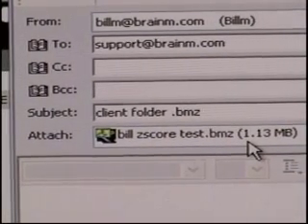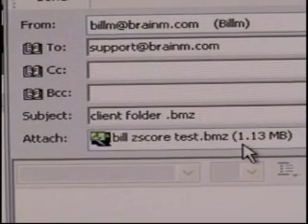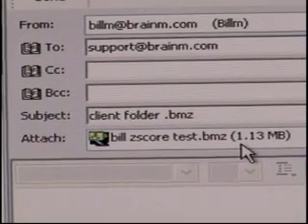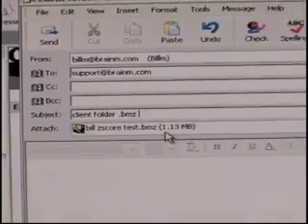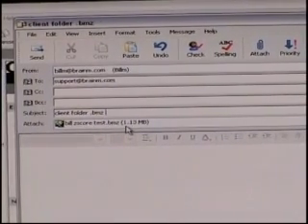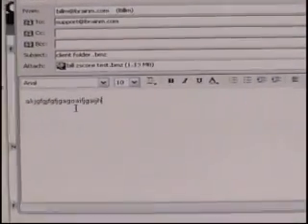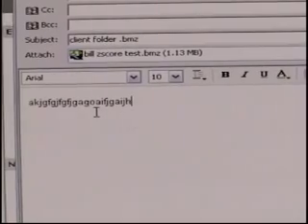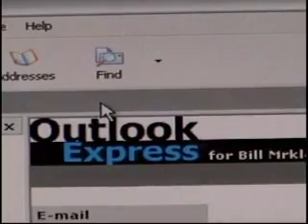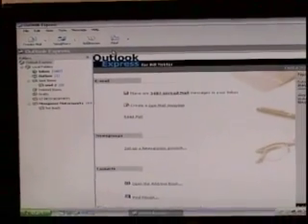but this time I've put it in there manually. So whether, again, I had that web-based email or an email server that wasn't compliant and didn't open on its own or wasn't automated, we can then use this manual version to go ahead and still get the file to the client. So again, in the body I could put any little message, just putting in filler there, and then I could hit send. Now the client's gotten the file that I was requesting them to do their sessions.